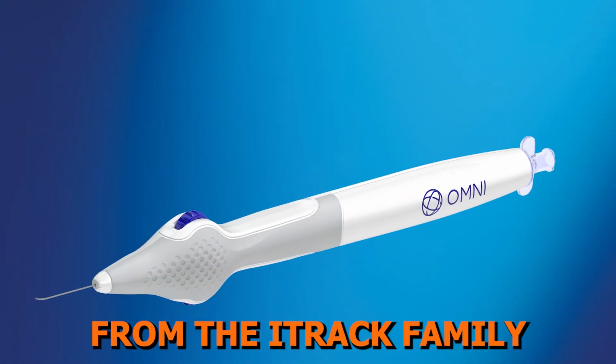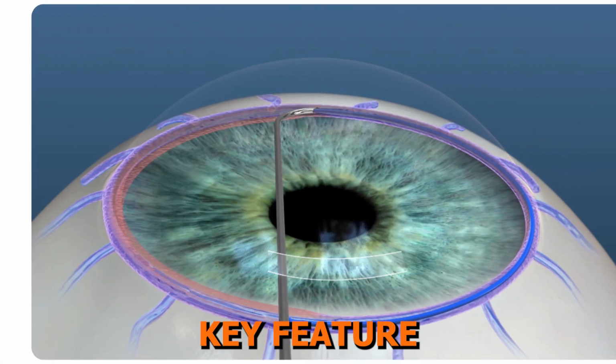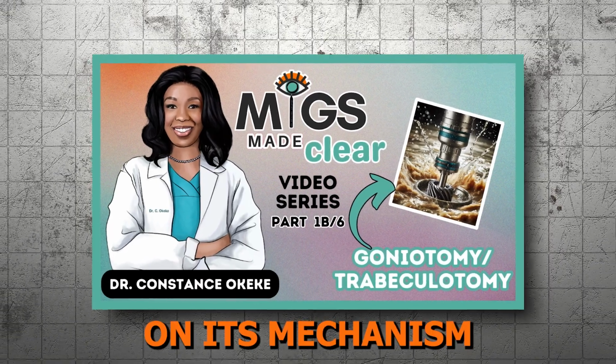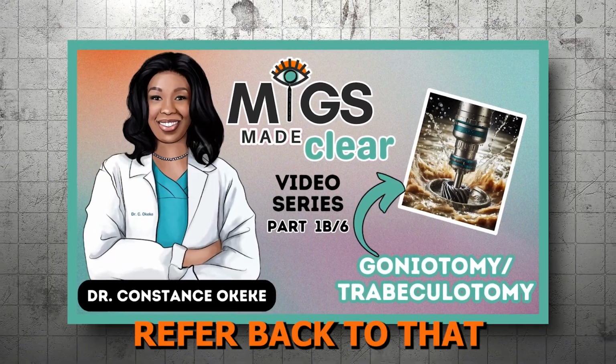Now we move away from the iTrack family and move to the OMNI surgical system. The OMNI system's key feature is the ability to combine canaloplasty and trabeculotomy in one device. We also spoke in detail on its mechanism for trabeculotomy in the Part 1B video. Refer back to that for details.